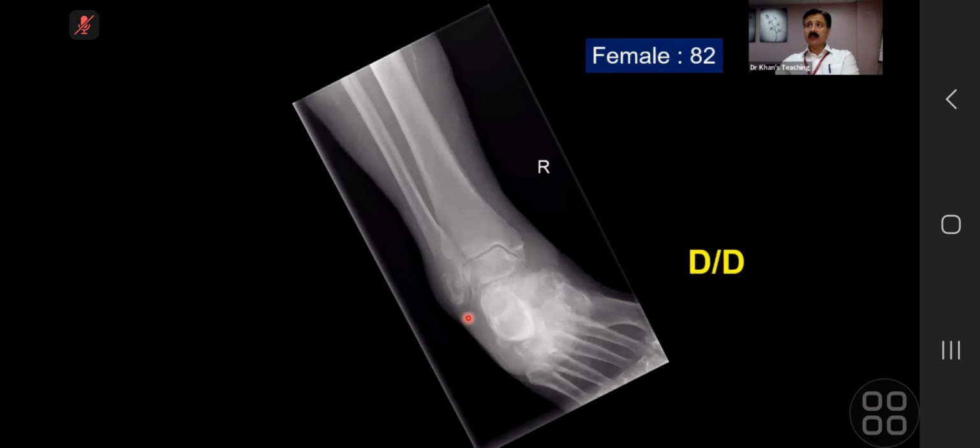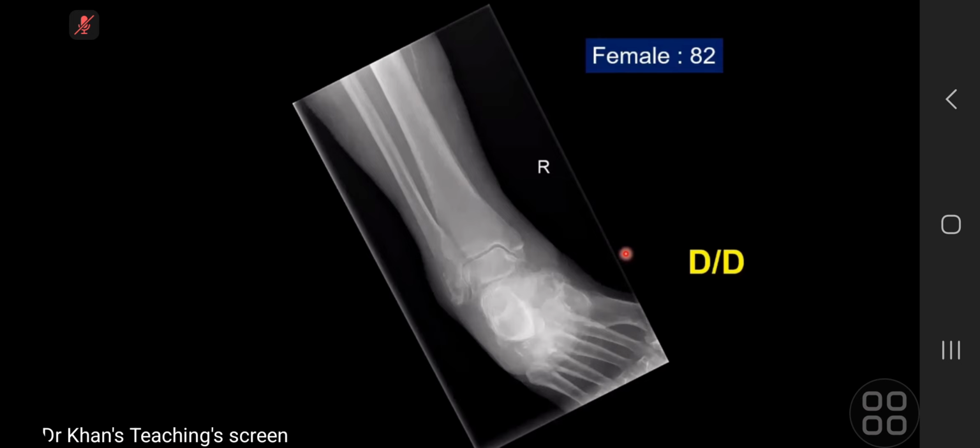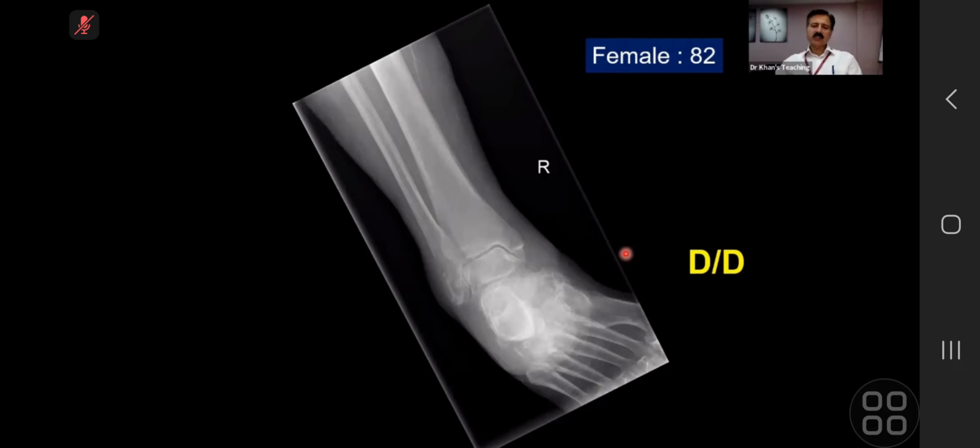Okay, candidate 7. This case has got periosteal reaction. What do you think is the cause? So periosteal reaction, which involves the lower legs. I'm still unsure because this is unilateral. I don't have the other side. Other side had similar findings. Okay, so it is bilateral and symmetrical.